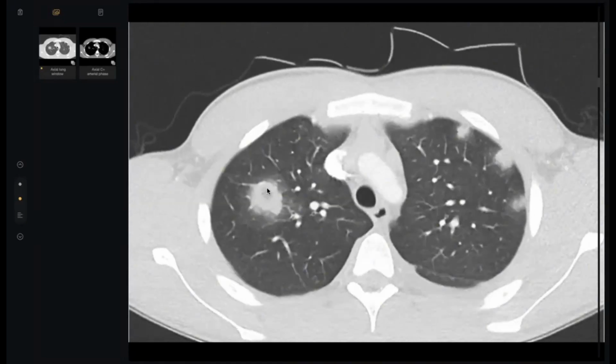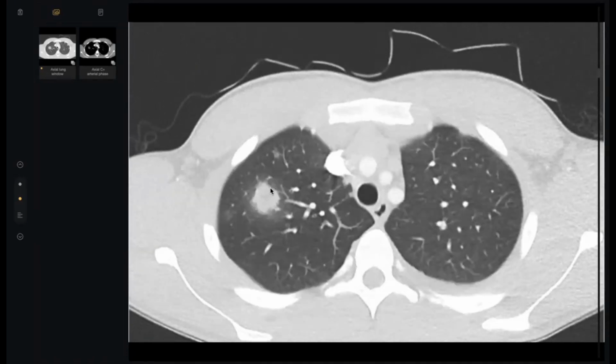The center here is cavitation. So when you find even one cavitating nodule, tell the examiner this is multiple cavitary nodules or cavitating nodules. Don't use the term cystic changes in chest X-ray or even CT. Why? Cavitary or cavitating. Okay, my colleagues. Thank you, doctor, so much.